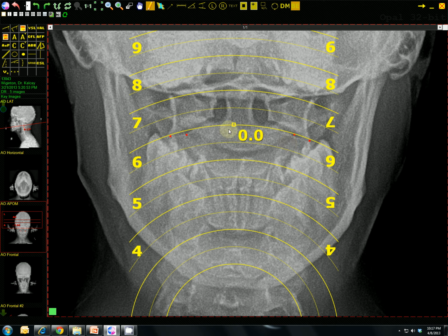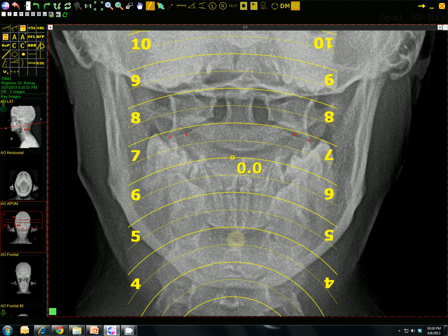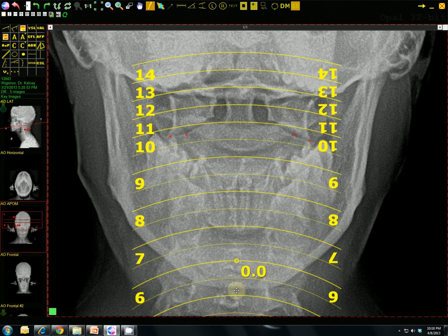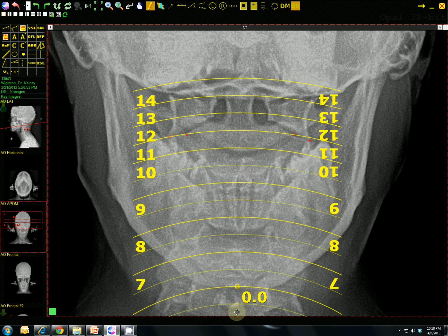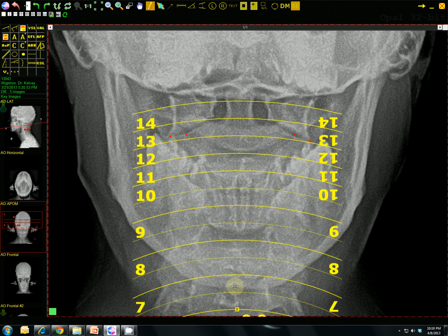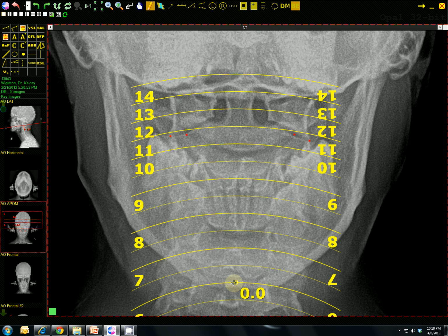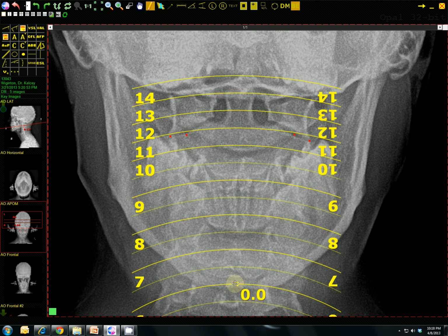Now to try and do the same thing, but disregarding this dot and instead going with this other one, I would have to come way, way down, bring the template closer to almost a 12. It was almost way exaggerated. And my video program's going a little bit laggy, I apologize. But it kind of gets the point across.